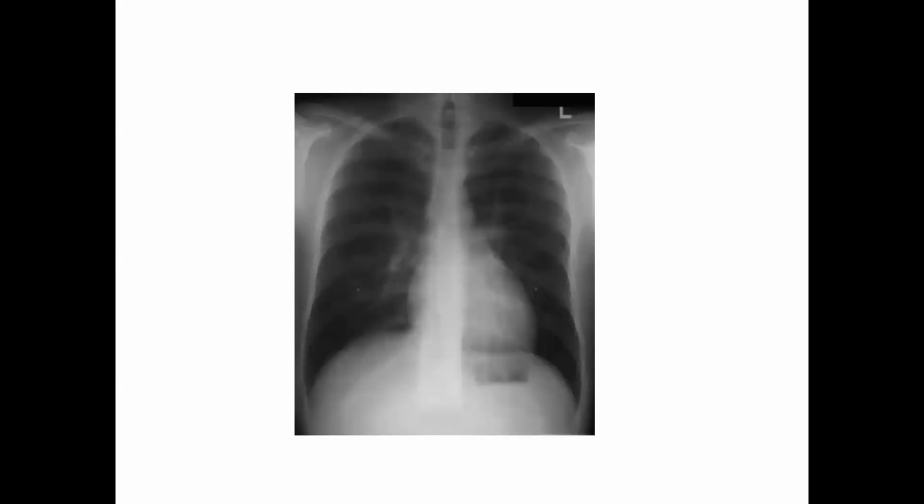This is a normal chest x-ray. It's oriented appropriately. You can see that your clavicles are pretty well straight across. So some things that we should be able to pick out, you should definitely be able to pick out whether or not there's a tracheostomy tube or an endotracheal tube. This is your normal spontaneous breathing patient, so we don't see that. So you want to make sure that you can pick out the clavicles. So your clavicles here.